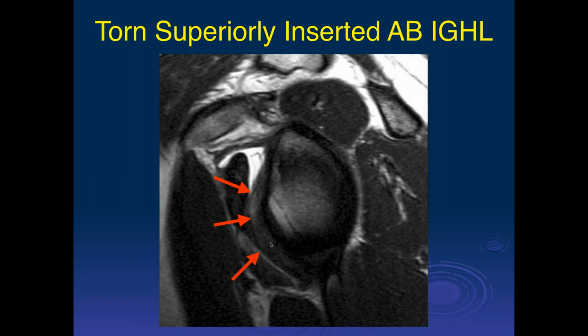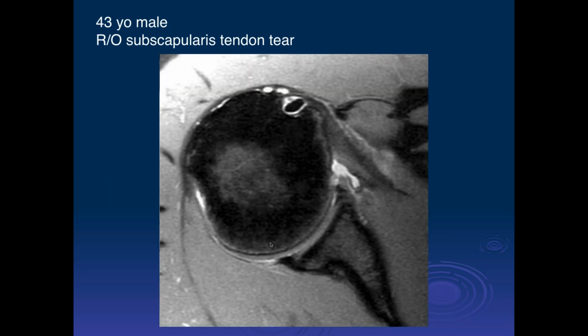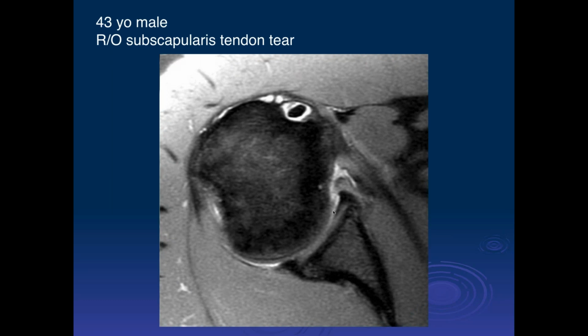And this isn't acute, is it, John? It looks like old stuff. Well, they're 43. The symptoms were acute. I think this was an acute injury, and this looks acute, John, because there's a lot of edema in it.